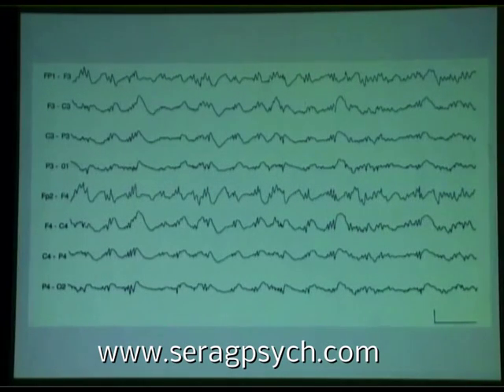Sometimes on bipolar recordings, these bisynchronous polyspike waves can be quite subtle. You see that? See how you could miss some of these there. It's nice and easy to see on a slide, but in the actual performance in the day, you might miss them. And they are diffuse, aren't they? I mean, you see them a little bit. Mostly delta is the easier thing to see. A little higher right than left, but not necessarily focal.